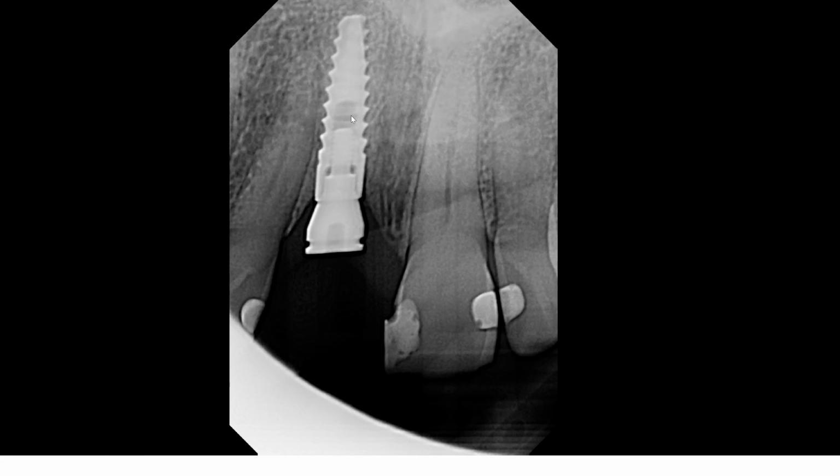Going back to our original topic, the fact that this is positioned more distally, perhaps the dentist did obtain a CBCT image prior to the placement of the implant. I think what is important to recognize is that there's a nasopalatine canal in this region, and in my best attempt to estimate the location of the foramen, I want to say this is the approximate location of the nasopalatine foramen, and you see a trace of radiolucent channel that extends superiorly, so I would presume this is the nasopalatine canal.